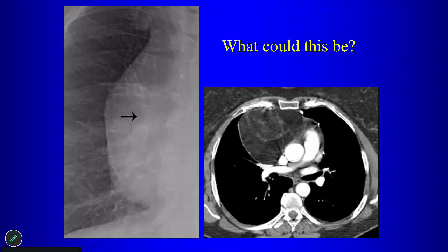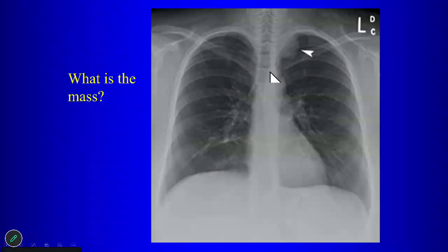Lipoma? Yeah. Well, there are some soft tissue elements in here, so probably not lipoma, but low-grade liposarcoma. You need to be concerned about that. But what else would be in your differential for a large fatty anterior mediastinal mass? Thymoma. Not thymoma, but what do we call it? Thymolipoma. Thymolipoma would be the differential. So this was a low-grade liposarcoma.